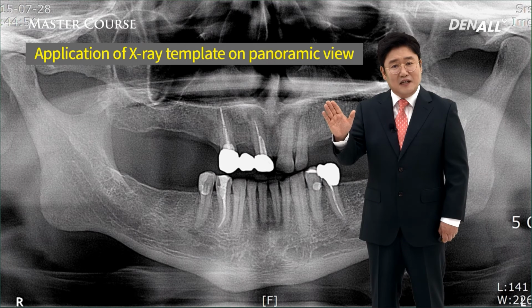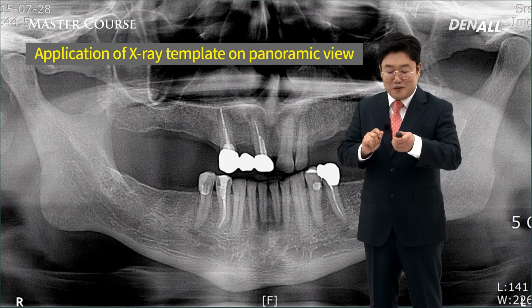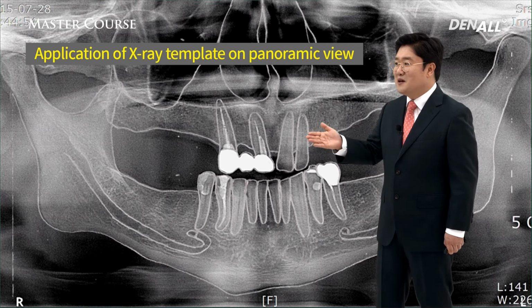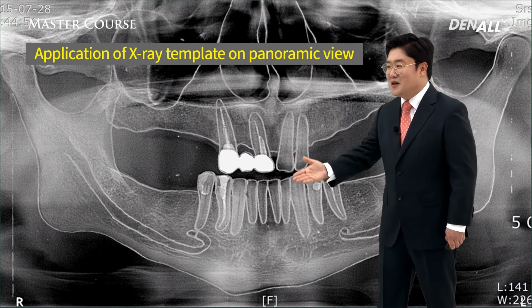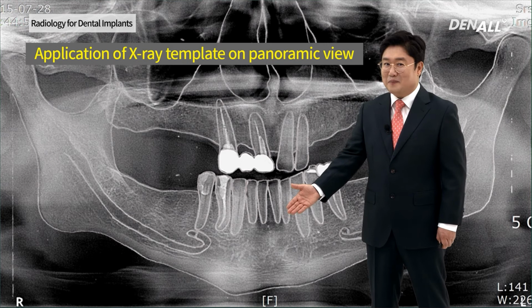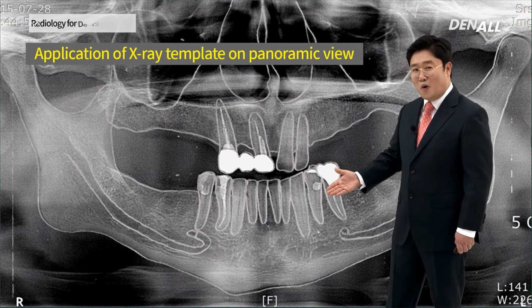After panorama is taken, the pictures are developed and transparent paper is put over it, and with a sharp pencil, tracing is done. By tracing, we can identify teeth, bone, maxillary sinuses, and the inferior alveolar nerve running canal. Not only that, the bone height is measured in the regions where implants will be placed.